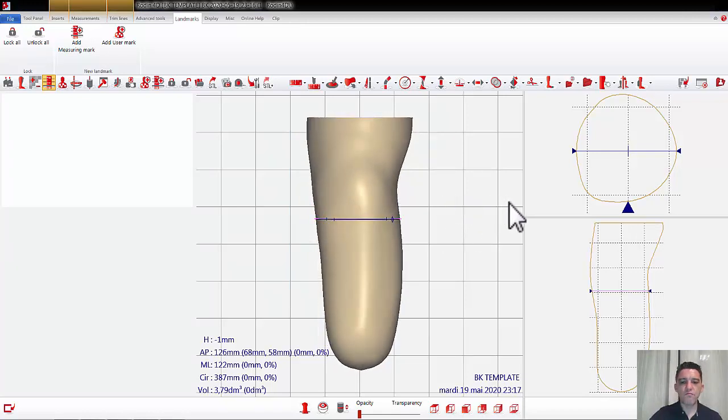Okay, to show you other things and possibilities, imagine that you want to create this template to rectify a PDS. You can start to use different tools to apply pressure, expansion, or something like this. But also you can go to other shapes you have in your computer to select and import here. This is the thing I want to do now. Here in my custom bar, you have the import tools.